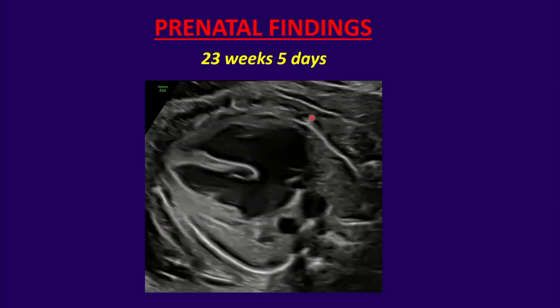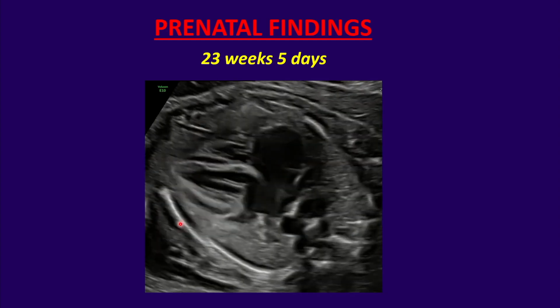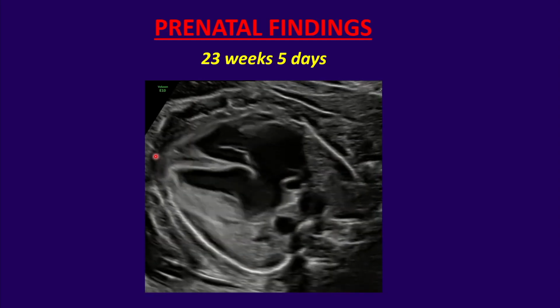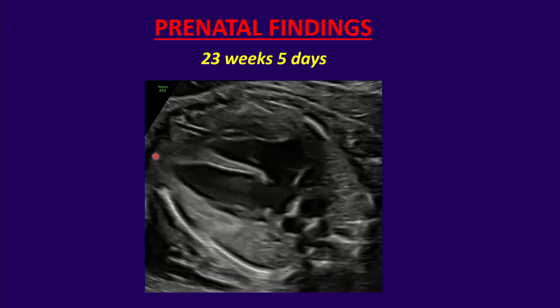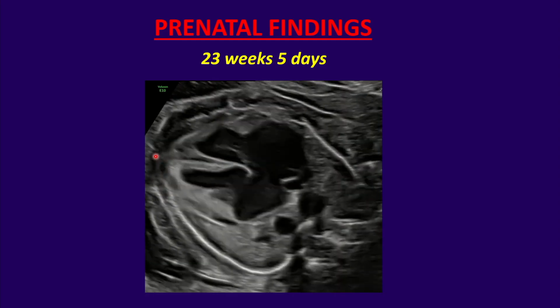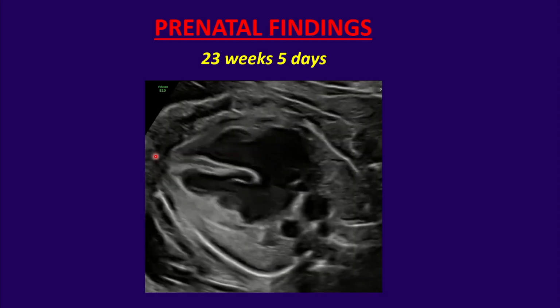I hope that you agree, and this is a complete rib on each side, so we're in a very nice axial plane. But the enlargement of the heart demonstrates a very symmetric enlargement of all chambers. This is what usually happens when we have volume overload, so there is definitely something happening to this heart, but we need to know what it is, so we're going to look further.